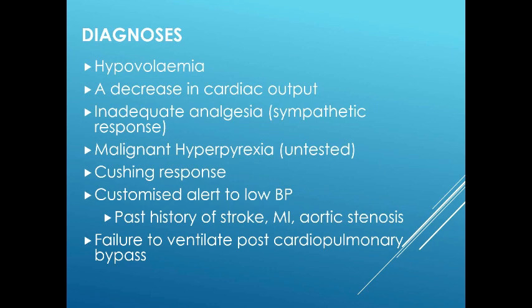Hypotension alerts are customized and are dependent on some comorbidities. These elements are selected at the beginning of the session, as you will see shortly. The last item is very specialized and was created as a response to a conversation with a cardiac anaesthetist.